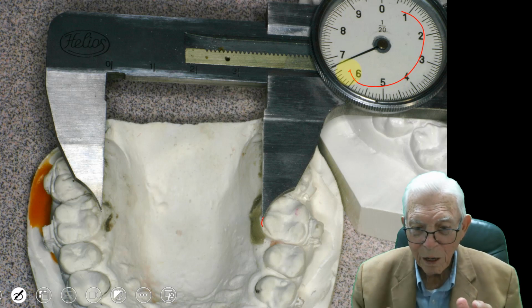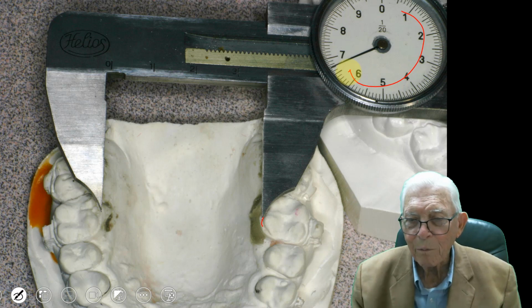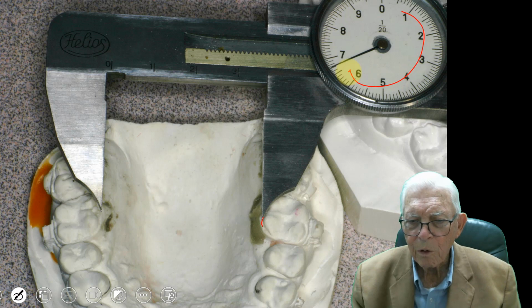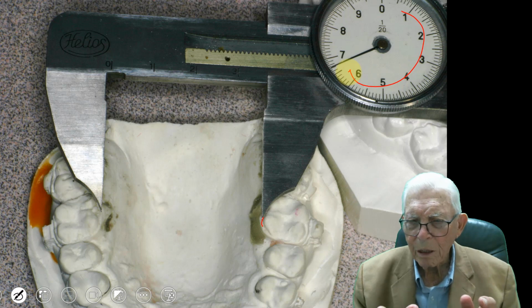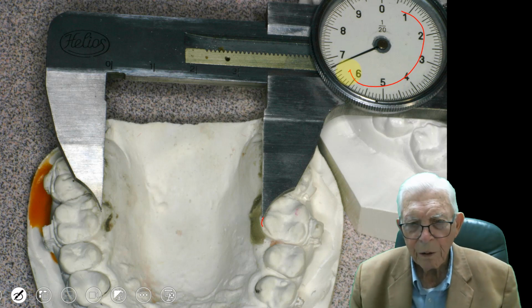But you can expand and bring in the arch. You can do any kind of movement. We have worked out a system in here where you can do any movement of the teeth that you really need to do. And I hope you adapt that. We use a lot of straight wire stuff, but we add some things to straight wire in there.